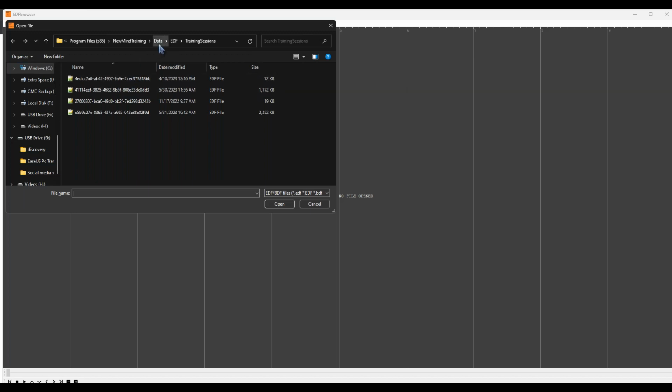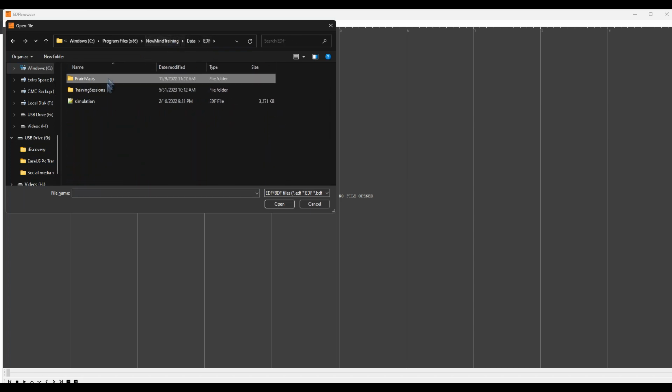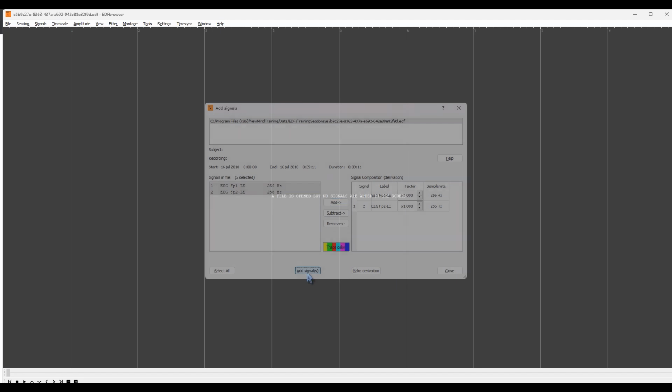Most of you will be doing this on the Windows computer that you have our software loaded on, so you want the option 64-bit for Windows 7 or later. Just click on the link. It'll download a zip file, and then you go through a standard installation process like any other piece of software. Once that's loaded up and you open it, you click on File and then Open.